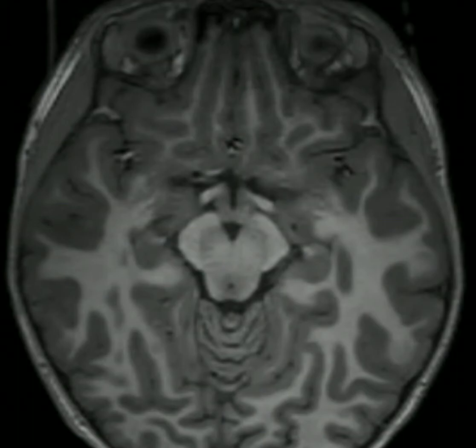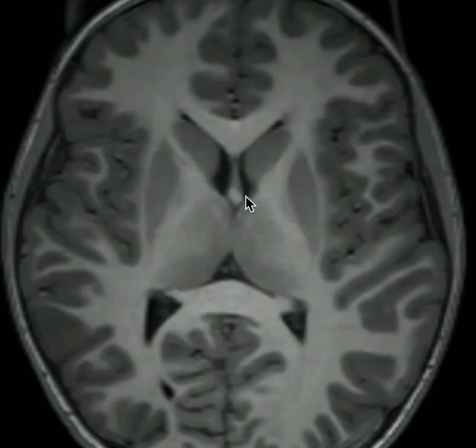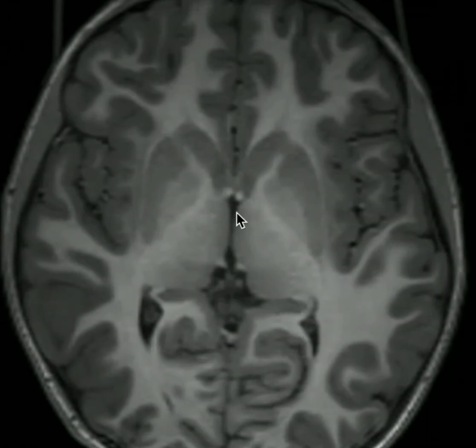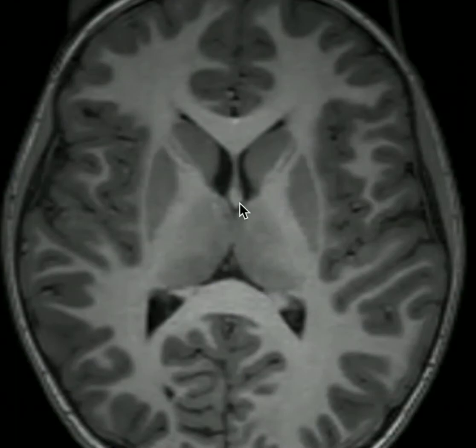We'll now review our cerebral ventricles here on these axial images. Scrolling up now to the level of our lateral ventricles, on this slice we're seeing our right and left lateral ventricle. If I scroll down a little bit, we'll see our interventricular foramina of Monro coming down, Y-shaped, down into the third ventricle below. I'll point out that the forniceal columns here will form the anterior wall of the interventricular foramina of Monro. Going back up superiorly for a moment, the portions anterior to the interventricular foramina of Monro are known as the anterior or frontal horns of the lateral ventricles.